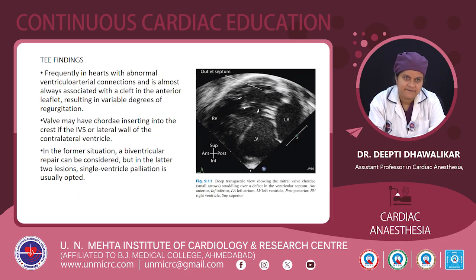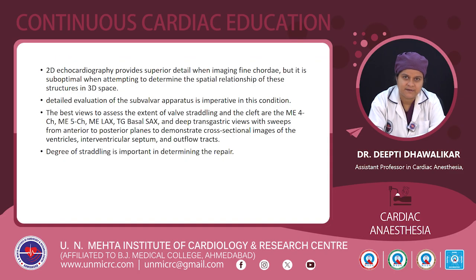TEE findings. It is frequently seen in hearts with abnormal ventriculo-arterial connections and is almost always associated with a cleft in the anterior leaflet, resulting in variable degrees of regurgitation. The valve may have chordae inserting into the crest of the interventricular septum or the lateral wall of the contralateral ventricle. So, in the former situation, a biventricular repair should be considered, but in the latter condition, single ventricle palliation is usually opted for. The adjacent figure is showing a deep transgastric view with the straddling of the mitral valve, which is seen across the VSD.